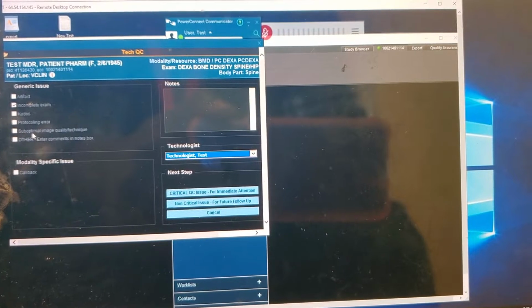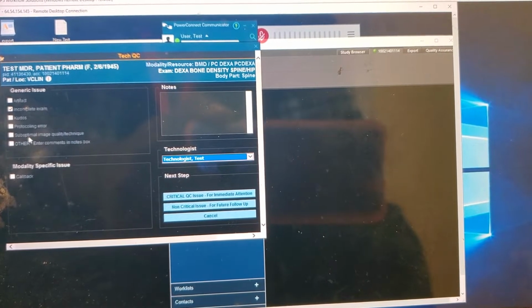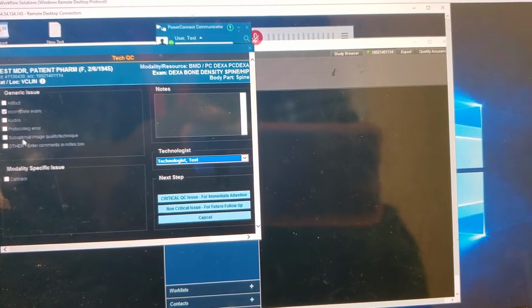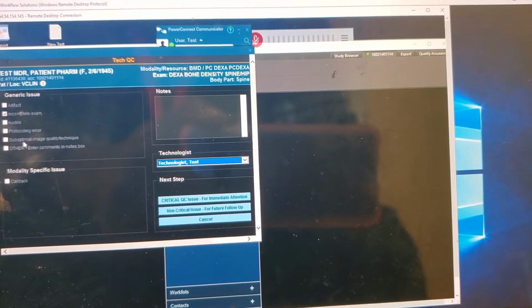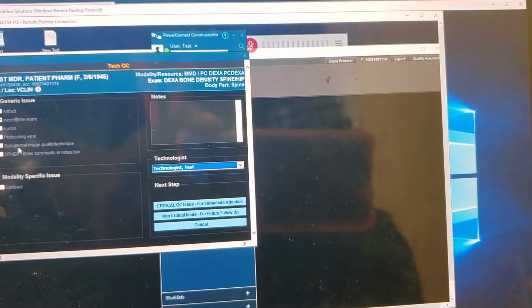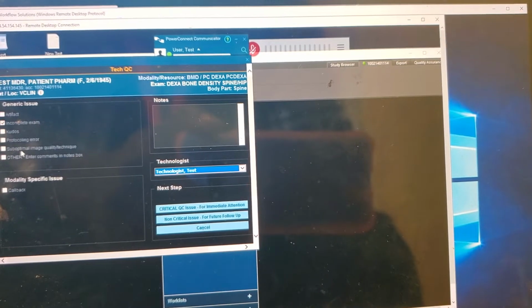And for the most part, it will drop off the reading work list. Most of our radiologists are filtering out or excluding the studies that are marked do not read. Some doctors may have it filtered to show. But nevertheless, it will create an event for someone to resolve before it can be read. And I'm going to show you how we do that.